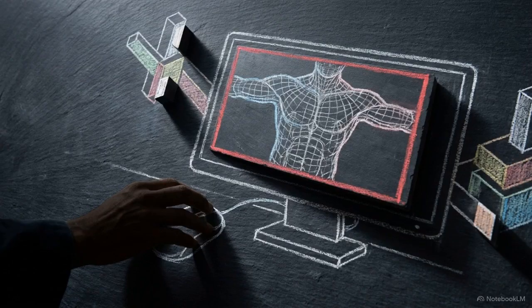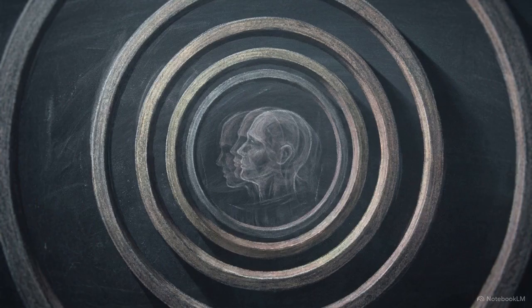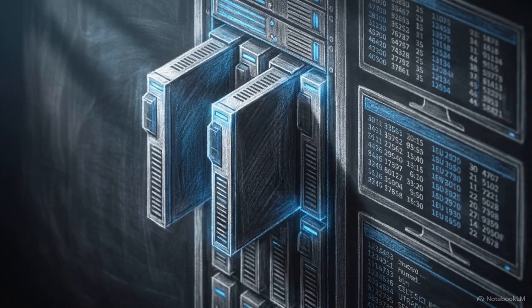The solution requires strictly adjusting the phase encoding parameters, either by expanding the field of view or oversampling the data. The phase encoding direction acts as the primary temporal bottleneck for the entire scan, trapping both patient motion and spatial limits in its slow acquisition. Once spatial encoding is complete, the focus shifts away from scanner hardware and into the digital compilation of K-space data.